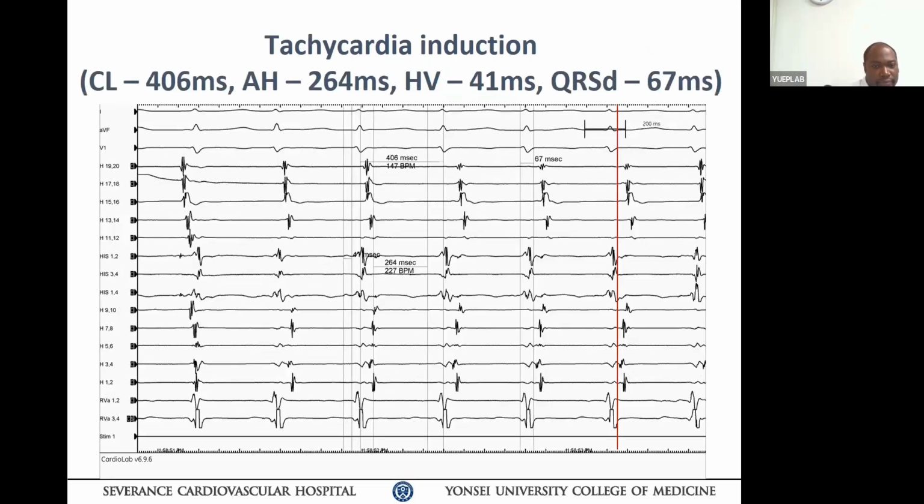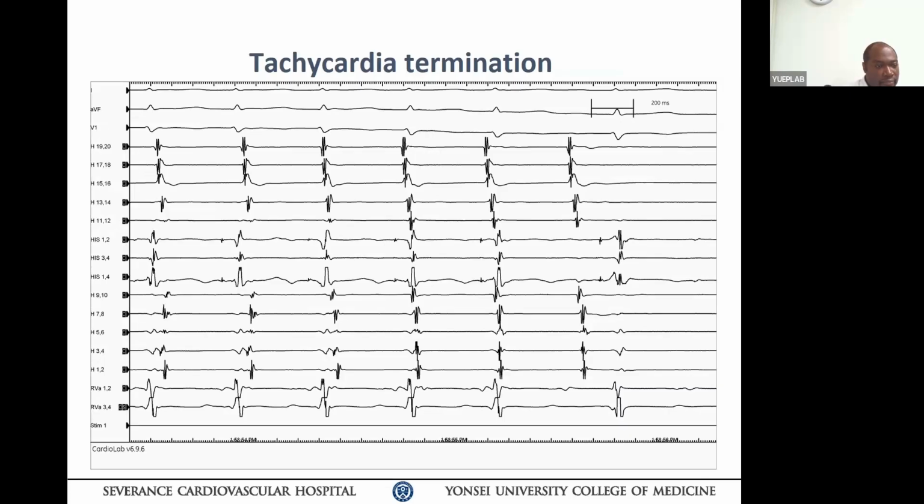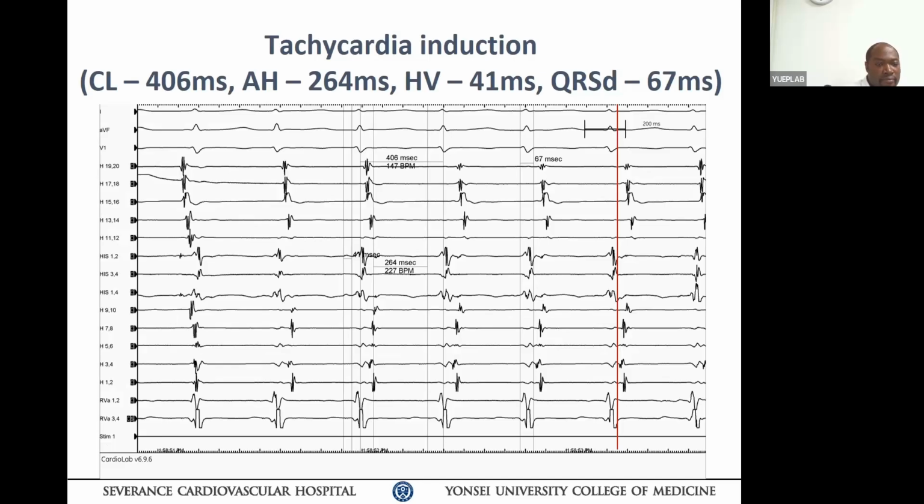Keep going. This has repeated again. You see that last one again? During the tachycardia it also happens, in and out of it. There's another case, right here. Take a look at it. You see your CS activation being overtaken by the atrial tachycardia, and then going back again, back and forward. So this is evidence that the patient has a double tachycardia going on simultaneously. It's not one tachycardia.